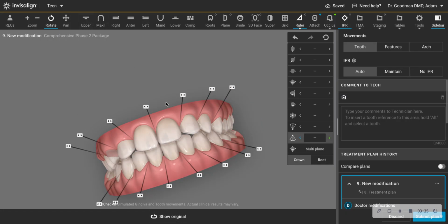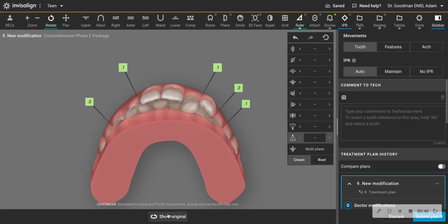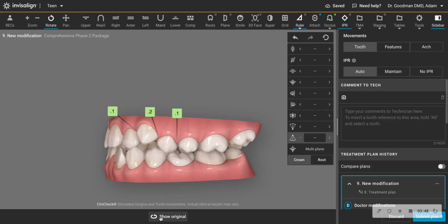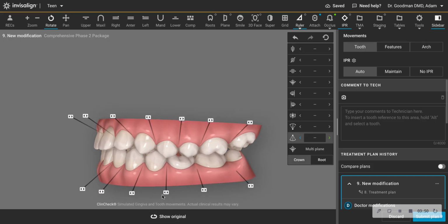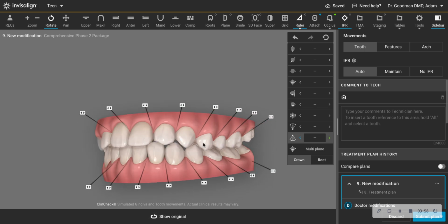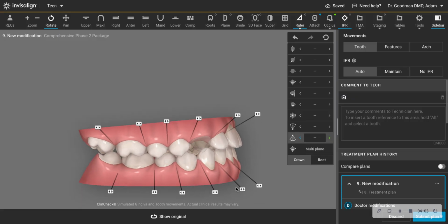And now it's kind of a different look, where you can see the teeth are more flared forward. And I'll discuss this with the patient, but I knew from experience that if I'm going to treat this non-extraction, that I'm going to have some flaring. And now, even if I'm going to use aligners, to me, this is going to be the natural orthodontic way teeth will move. And the aligners will be more effective, because if you try to put that much buccal root torque in, you're going to have a hard time moving the teeth reliably. All right, I hope this helps.